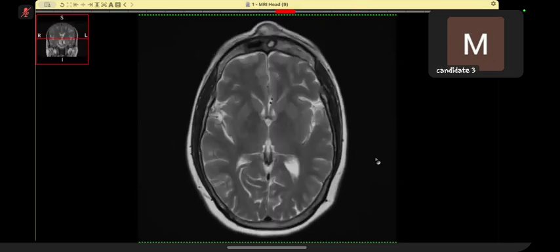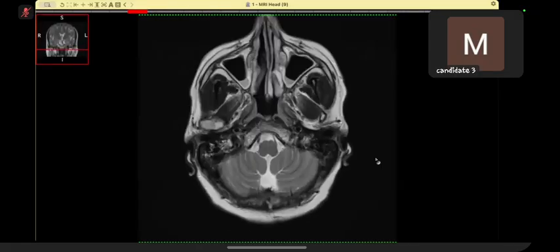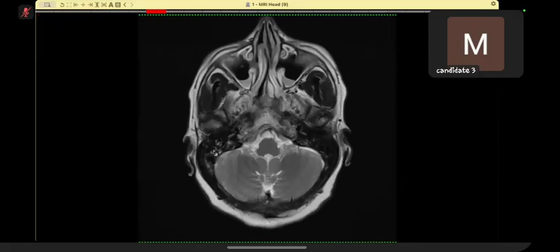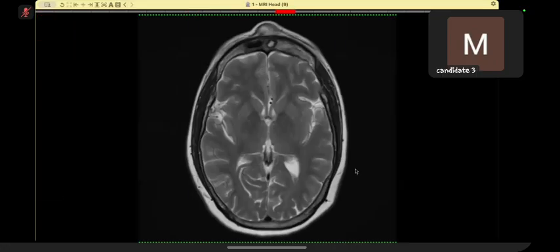So, in a 68-year-old patient, to conclude my findings, I would also like to have a look at diffusion-weighted and post-contrast images. Other than that, I can also see fluid opacification of mastoid air cells and some mucosal disease as well in the rest of the paranasal sinuses that needs to be further evaluated, if the patient has pain in this swelling and history of fever or any sinus disease which was pre-existing before trauma.